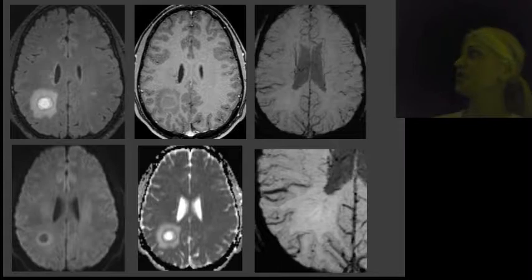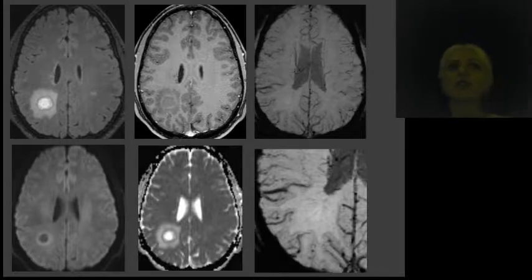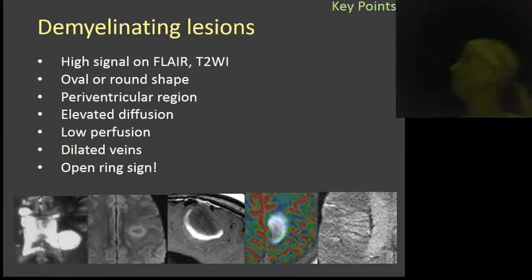This is a case: you see this lesion, it's a ring, it's bright on T2, it has a dark rim, it has some kind of halo-like edema, it has nothing really here, it's very difficult. But if you zoom in and pay attention, as Paul would say, this SWI is so great, you see so many things, and now we have to figure out what that is. I love this intramedullary vein running through the lesion. So this is a key point in demyelinating lesions that can be ring-like.